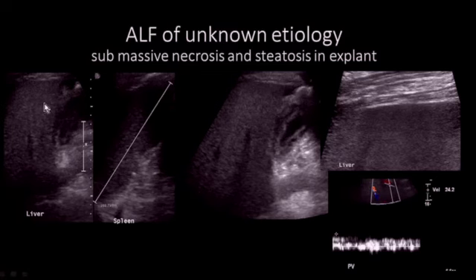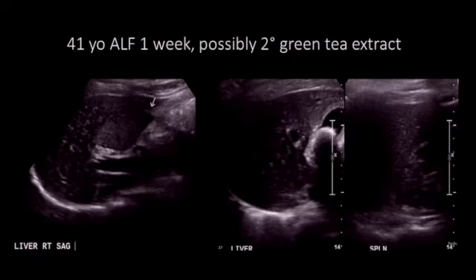In this situation, here is the liver, small gallbladder again, poorly distended. This is the spleen. So this liver was overall a little bit more echogenic than the spleen, but not enlarged, homogeneous, and had a smooth contour with normal portal flow. So the important thing is we would not mistake this for cirrhosis. This is clearly not a chronic liver disease, and that's very crucial information for the clinicians.